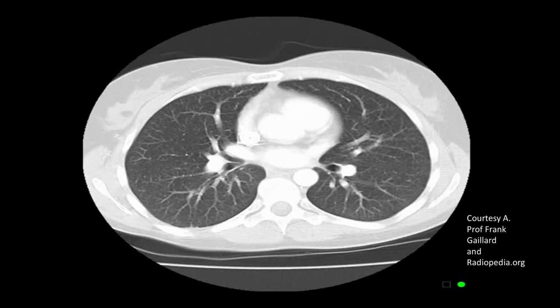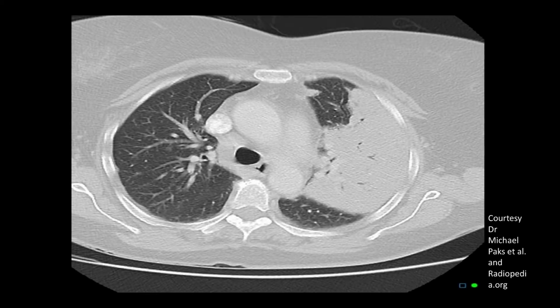Since the normal lung is air-filled, ultrasound can't penetrate it well, and we can't see it structurally with ultrasound like we would with a CT scanner. Of course, when the lung is very abnormal, much of the air is lost, and it becomes like any other tissue and relatively simple to see with ultrasound.